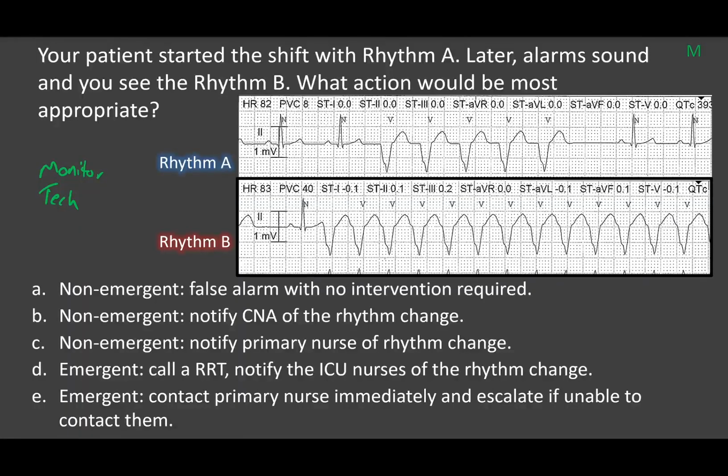Your patient started the shift with rhythm A. Later, the alarms sound and you see rhythm B. What action would be most appropriate?